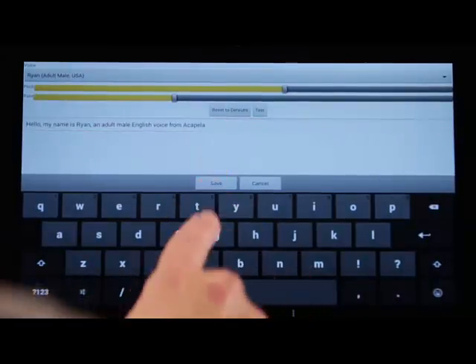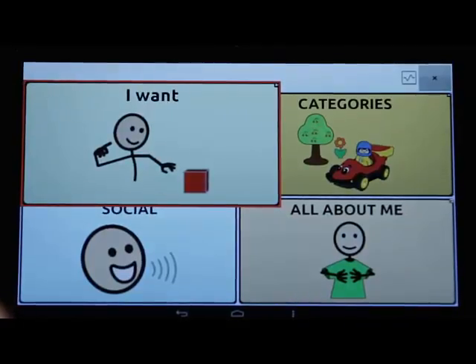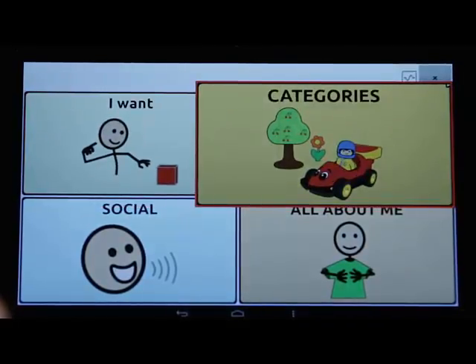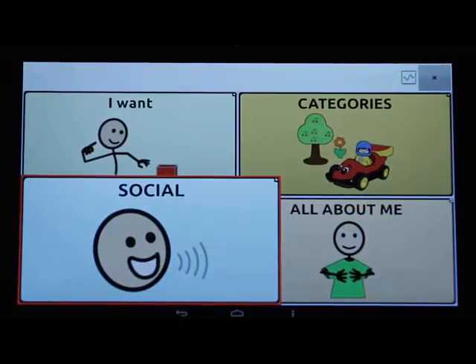Hello, my name. I want. Categories. Social. Hello.